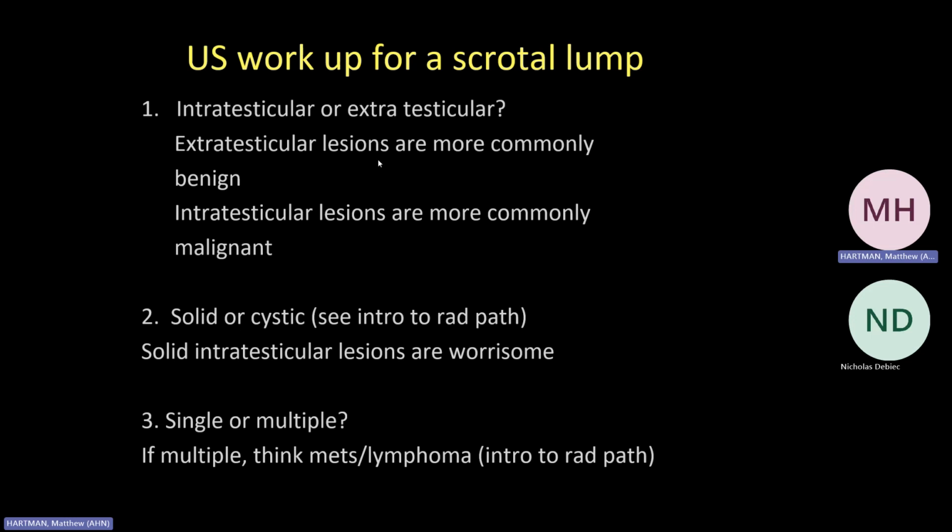Extratesticular lesions are often benign, whereas intratesticular lesions are often malignant. So again, extratesticular good, intratesticular bad. Going back to our basic RadPath lecture, anytime you have a lesion, answer: is it solid or cystic? A solid intratesticular lesion is worrisome. Another question: single or multiple? If it's multiple, think mets or lymphoma.